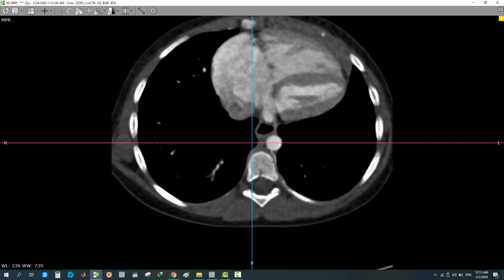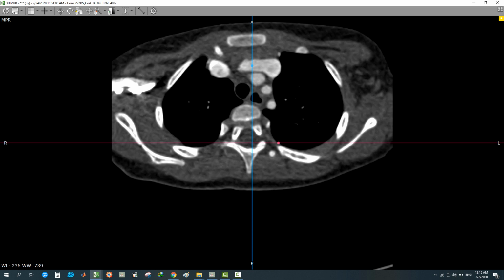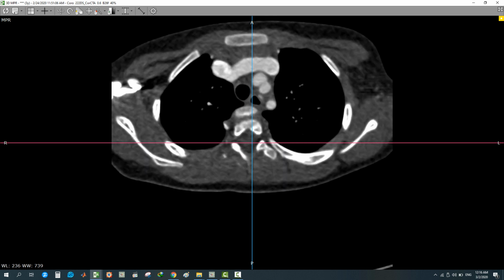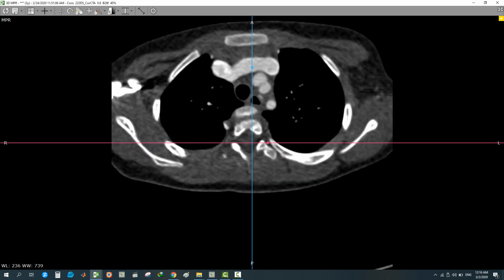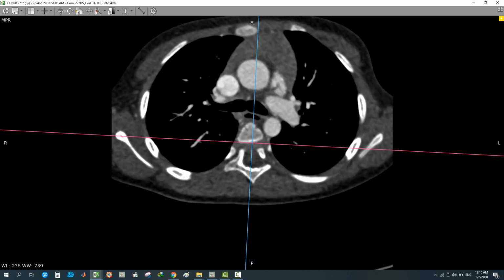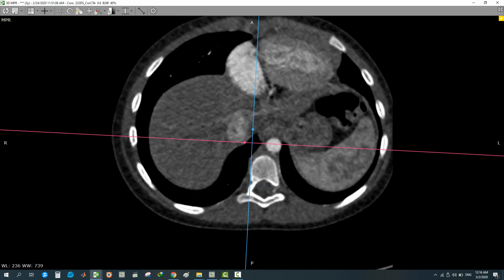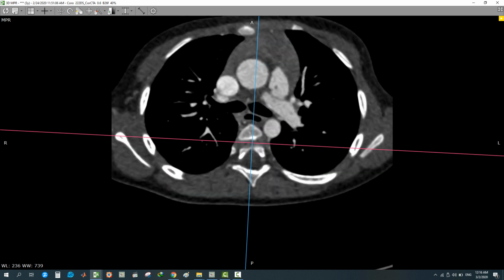After all, you need to check the systemic veins. This is the left brachiocephalic, normal course in front of the arch branches. Okay, normal appearance and homogeneous filling of left brachiocephalic, right brachiocephalic, and this right superior vena cava. Okay, and the visualized portion of the IVC, no interrupted IVC, no persistent left superior vena cava. Okay.